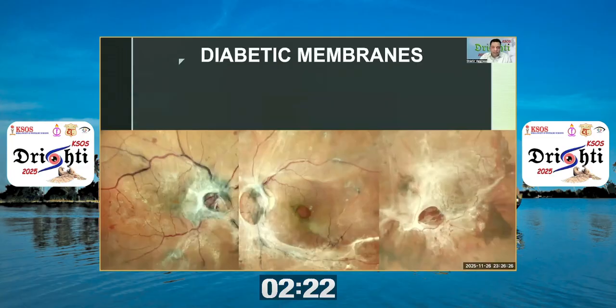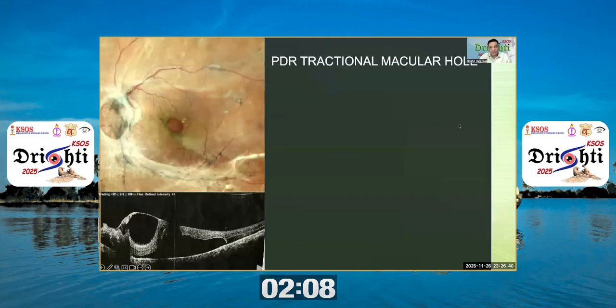I'll just briefly touch upon other membranes which we see in proliferative diabetic retinopathy, which can be from focal membranes to quite extensive, even extending beyond the posterior pole, as you see in some of these cases here. We can have a tractional macular hole in diabetics where the membrane is pulling one lip of the hole open like that, along with some presence of subretinal fluid, like what you see here.